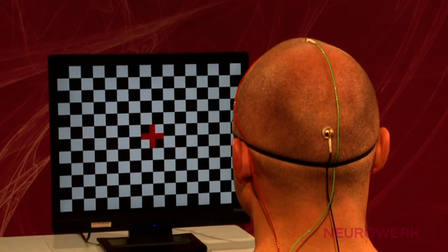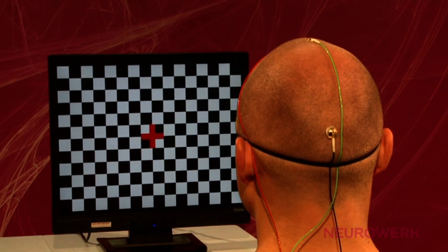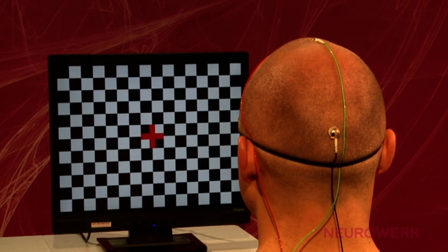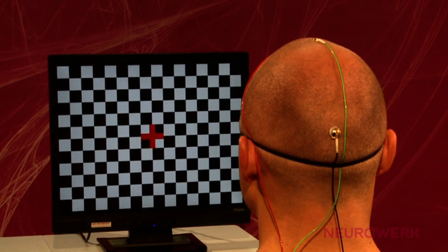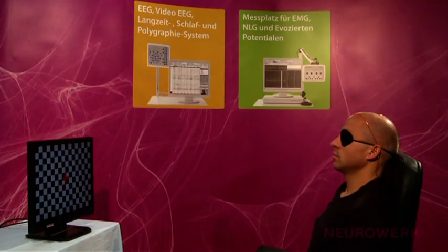Visual evoked potentials usually take place on one channel and by using pattern reversal stimuli. The stimulation occurs through a steady switch over of light and dark squares, which is the so-called checkerboard pattern on a monitor. It is recommended to place the stimulation monitor on a height adjustable table, bracket, to position the monitor accurately at the eye level of the patient.